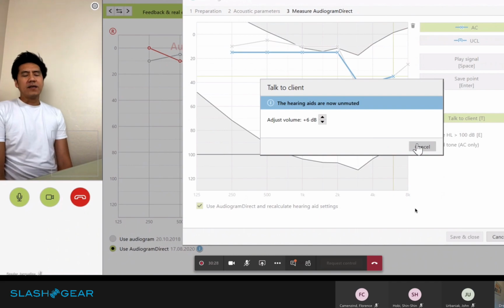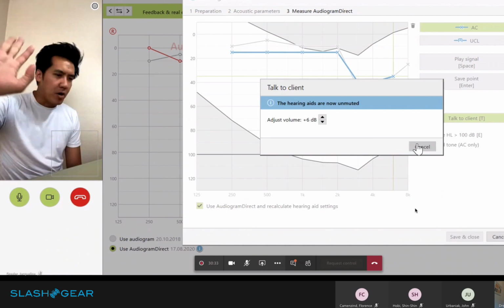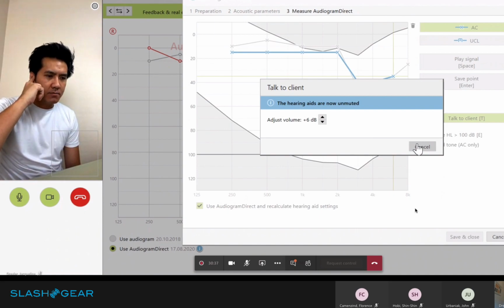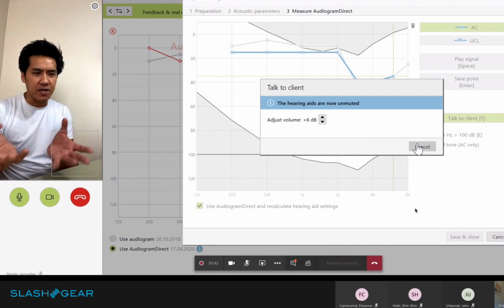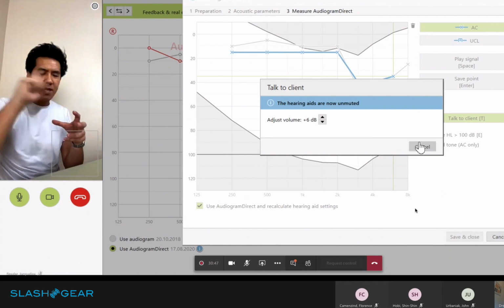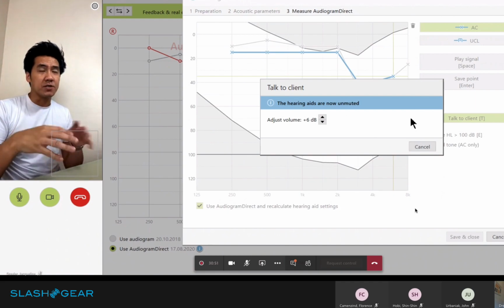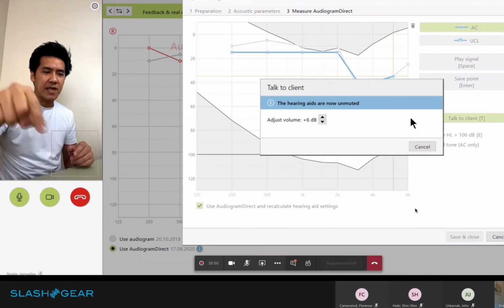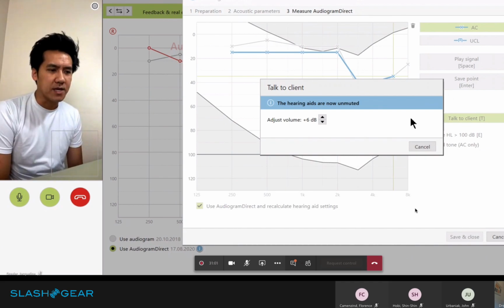Yeah, I think all they would need to do is just completely mute the app on your side. That way, it would be kind of like in the sound booth when I'm there at the office, right? Because when I'm getting the hearing check in a sound booth, I'm not hearing any external noise, whereas here the room is relatively quiet except for a little bit of the air vent. I'm contending with the sound coming from the phone, which I'm sure they can easily just mute.